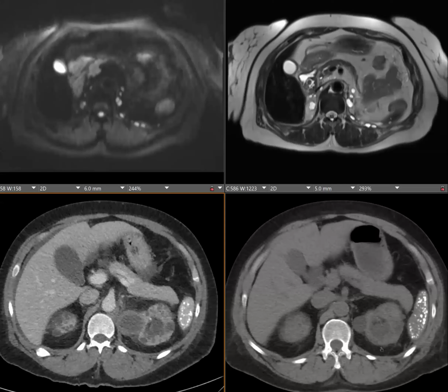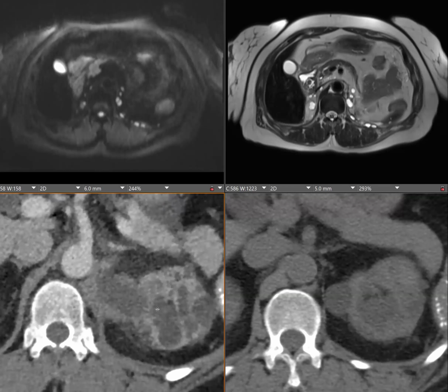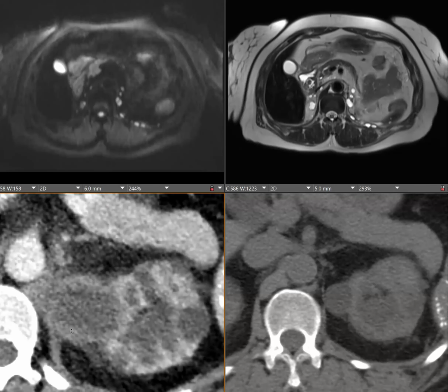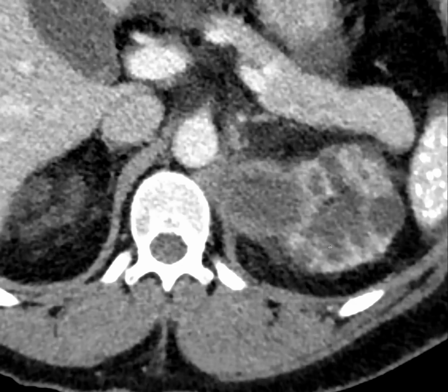It was only 6 months between this and this, so something happened. There's rapid, scary growth with a thick rind of tissue. You can see some soft tissue inside here, like nodular soft tissue. Is it big? Oh, it is contrast actually. Is it enhancing? This is contrast.